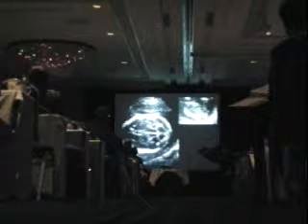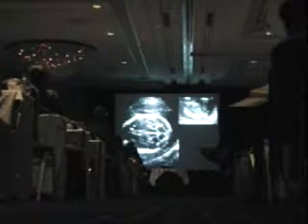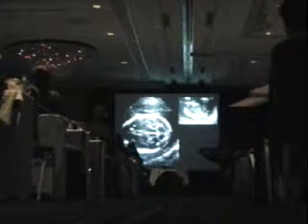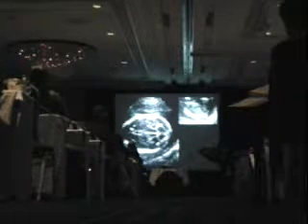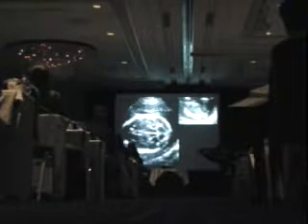So I said to the sonographer, "Oh, did you find a neural tube defect?" She said, "No, I didn't. This is a normal case." And I said, "But I know there's a neural tube defect here because there's a lemon and there's a beautiful banana. In fact, I've rarely seen such a nice banana sign as the one that she actually photographed. This is it." And she said, "But this is my picture of the spine, and the spine looked fine."